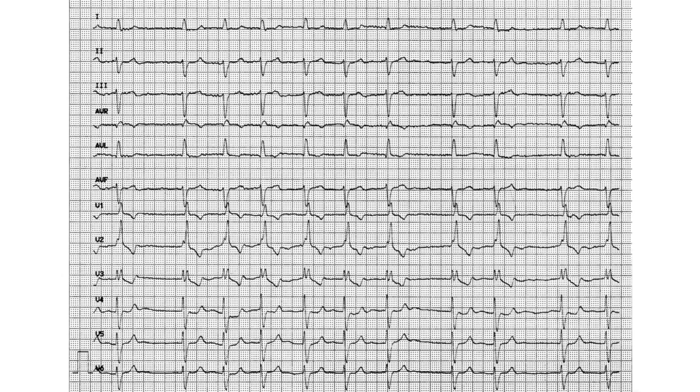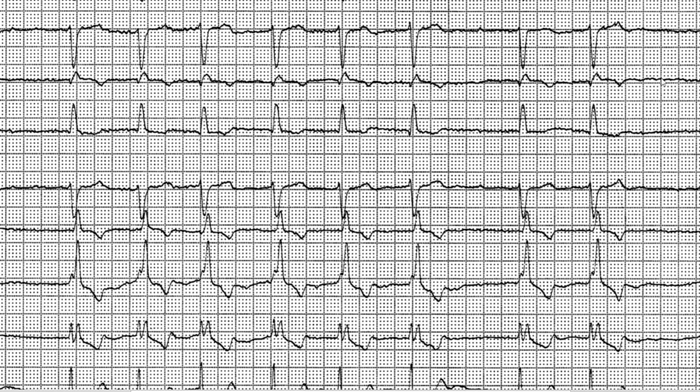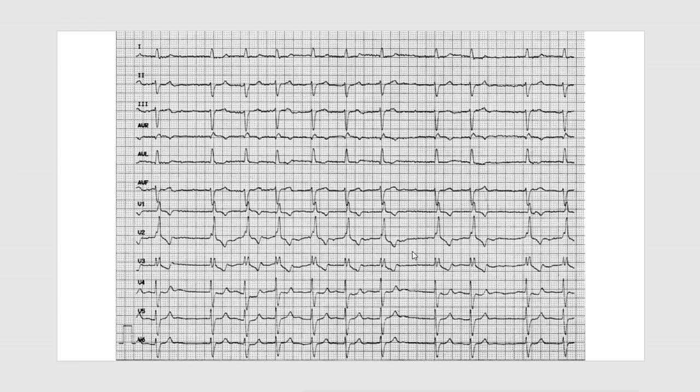And basically the next thing to look at in here is what is the frequency of this fibrillation that we have found. We've got to find where to take it from. It's going to be this empty area over here. This looks like a possible area, and this is very hard, but just decide that something is a peak. Say here 1, 2, 3, 3-ish, 4-ish. So roughly say that it's 1,500 divided by about 3.5, and you get a rate between 400 and 500, and that is enough. Okay, no PQ. Do not calculate the PQ interval.